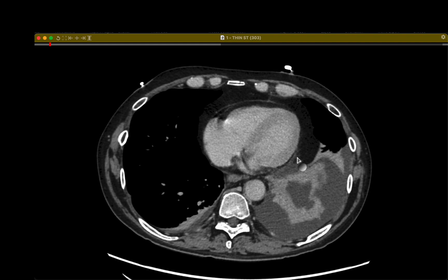This can be important for a couple of reasons. First, we want to not mistake this for a malignancy, but also if the patient is having complications related to hypersplenism, that this residual splenic tissue can be contributing to the problem, even though the spleen itself has been removed.